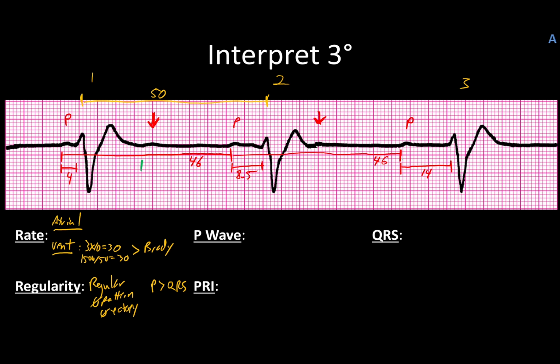Let's see here. Starts right around here. What you find is just by marking it, those wind up being .23.